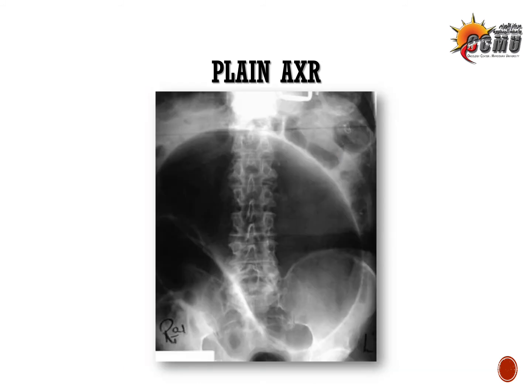Okay, this is the same sigmoid volvulus. It's actually a very easy spot diagnosis, but you should mention the whole points. So start with the type of the film, the view, what does it show normally, and then the abnormal finding, and you should end with the most probable diagnosis or provisional diagnosis.